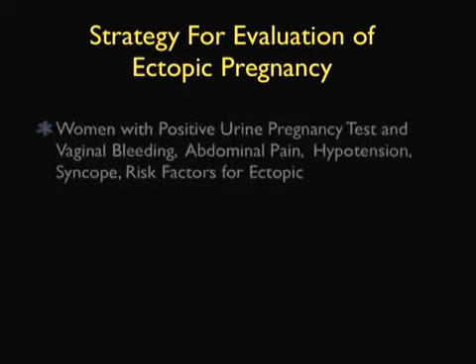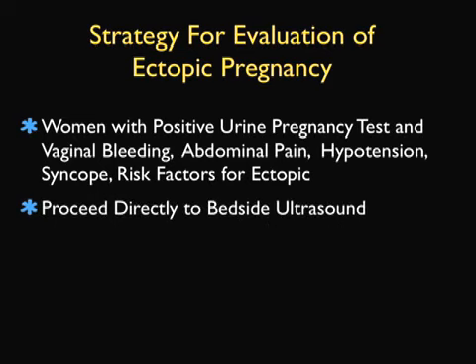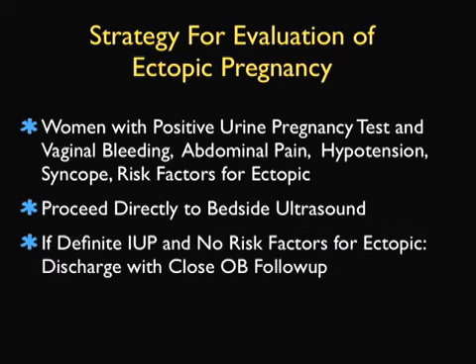So now that we've looked at a bunch of ectopic pregnancies on video, let's go through a strategy for the evaluation of ectopic pregnancy in the emergency department. In women presenting to the ED with a positive urine pregnancy test and vaginal bleeding, abdominal pain, hypotension, syncope, or risk factors for ectopic, you should proceed directly to bedside ultrasound without waiting for the serum beta-HCG.